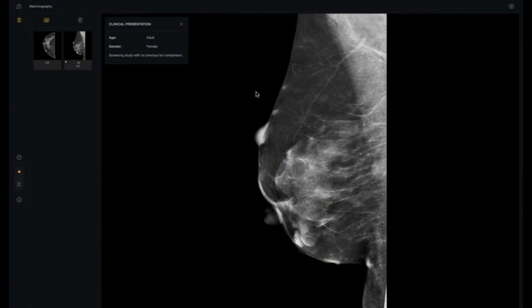In the right axilla, I can appreciate a few lymph nodes. These skin lesions, I can give differentials in this case. These could be some neurofibromas or other skin tags. The nipple is looking normal. Skin is also normal except for in the retroareolar region. It could be projectional.